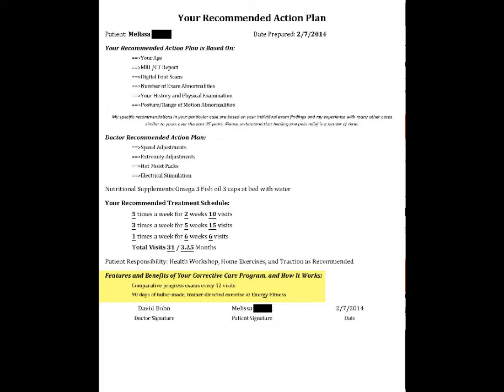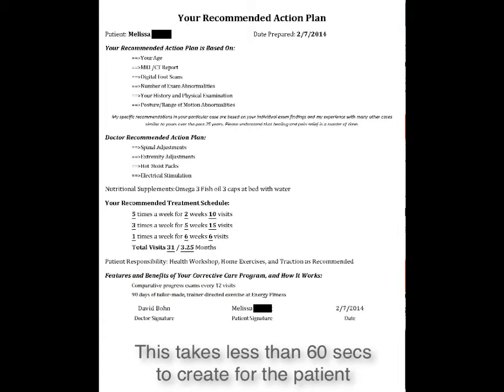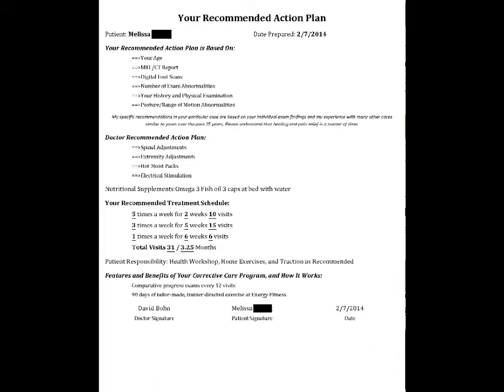And I'm also going to get you set up here next door with 90 days of trainer-directed exercise here at the local gym. So does that all make sense? All right, so with all of that, I've given that patient more than they get almost anywhere else. All of that took to create this will take you literally less than 60 seconds. All right, 60 seconds, you can print this up, have this ready to give.